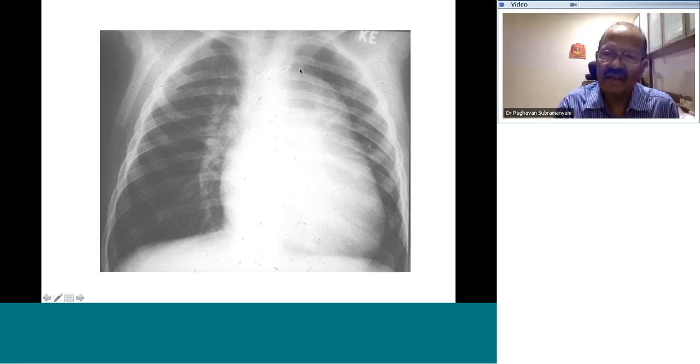For example, with an aortopulmonary shunt, the aorta is dilated and then you have a main pulmonary artery. But generally in those cases, you would always see a distinct contour. You will see an aortic contour, and then you will see a pulmonary artery contour. This seems to be one continuous shadow going right up to the clavicle from the heart.